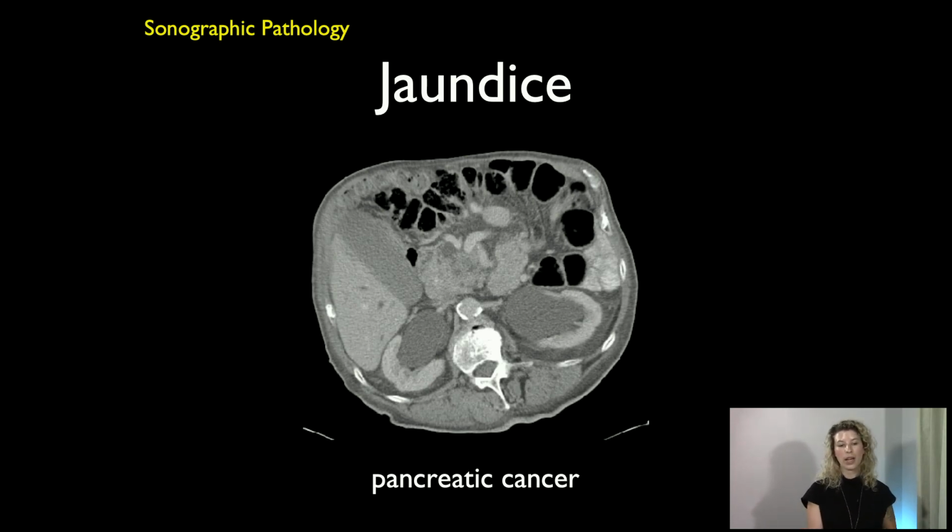Because this patient had a CT scan done and it showed a very large pancreatic mass, which is why they were obstructed. It wasn't because of a stone.